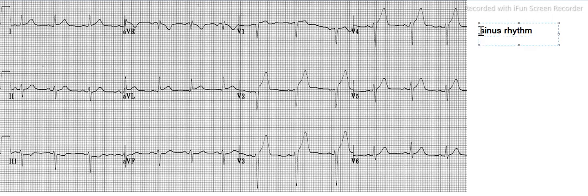And as we have already discussed, to fall under sinus rhythm, there must be a positive P wave in lead 2. So we will be looking for lead 2. So here is our lead 2, and here you can see I am drawing a circle with red. These are the P waves, and you see the P waves are positive. So one criterion has been fulfilled.